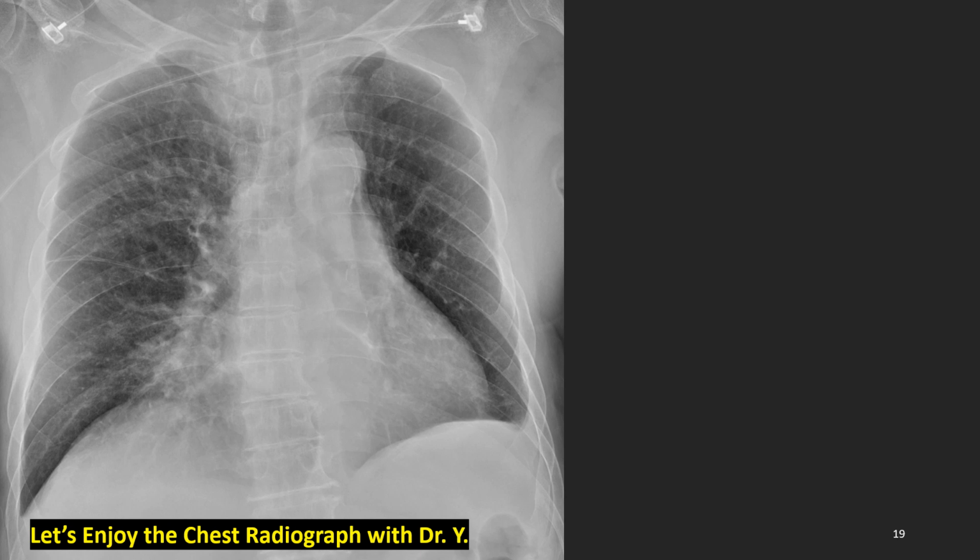Now we are going deeper and deeper into the lobar and segmental anatomy and the silhouette sign. Maybe we have met this kind of image before in the anatomy session, session 2. What do we see? Yes, preserved right minor fissure and obliteration of the right heart border.